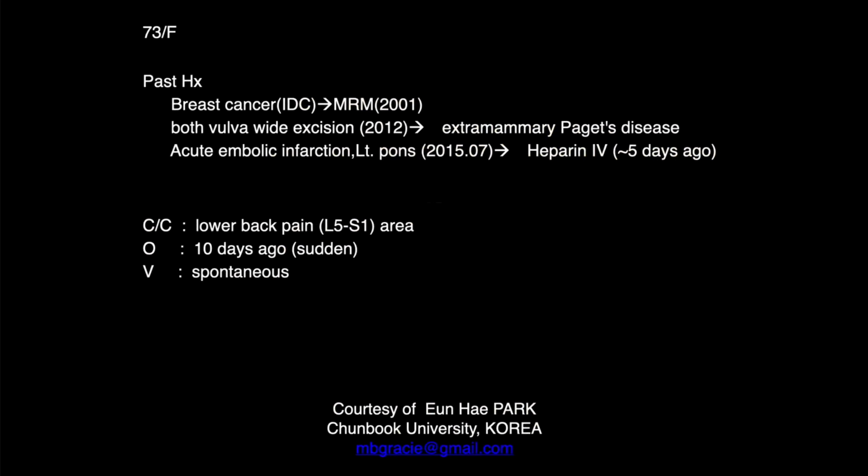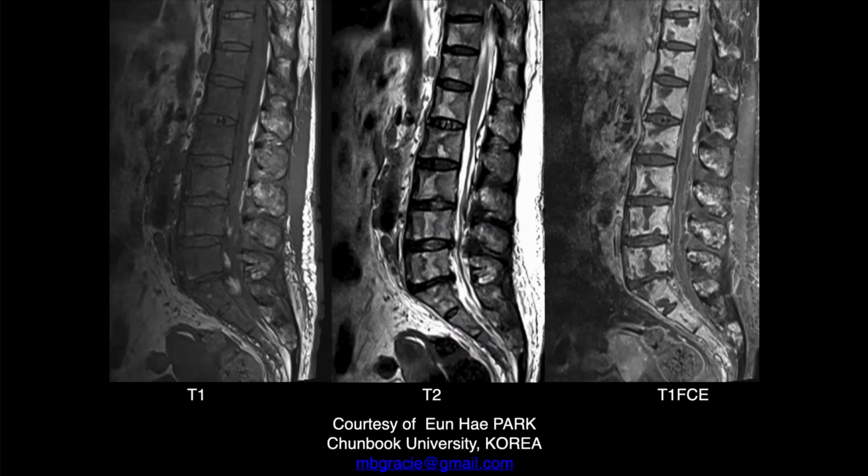Elior. 73-year-old woman, past history of breast cancer, MRM, wide excision 2012, extramammary Paget's disease, acute embolic infarct to the left pons 2015 treated with heparin. Okay, lower back pain, started 10 days ago suddenly.